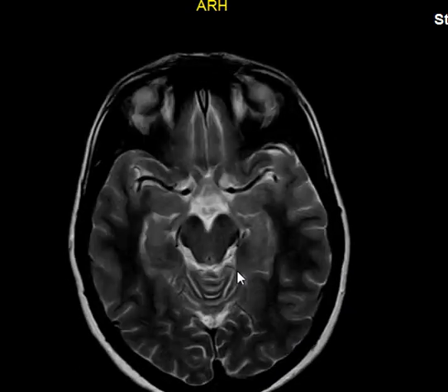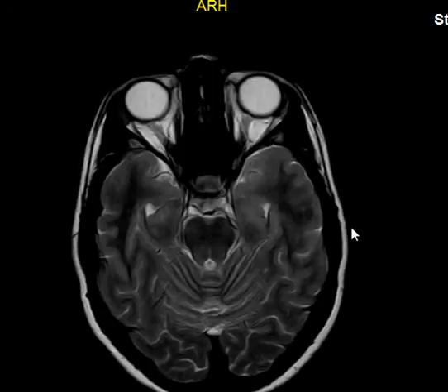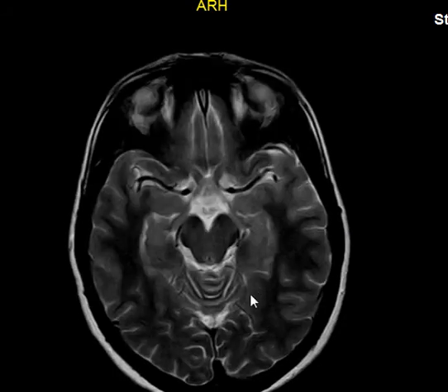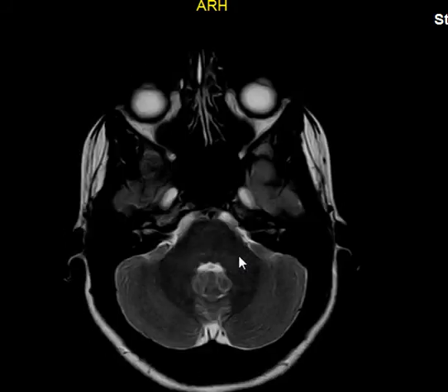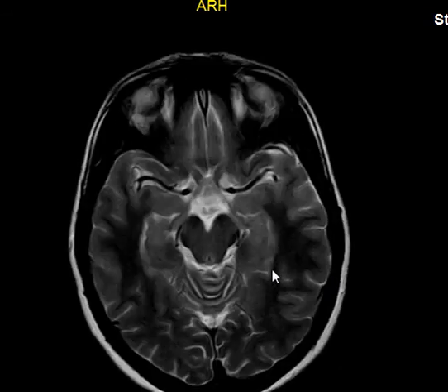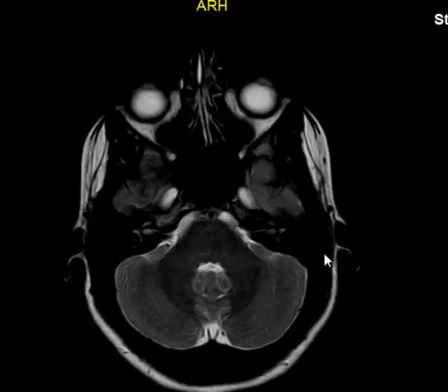And then, let's try to look for further anatomy. The basal system we covered last week, and then as we go down, we'll join the pons. The pons, and then the medulla. Before we go into the pons, each part of the brainstem connects to the cerebellum by a cerebellar peduncle.